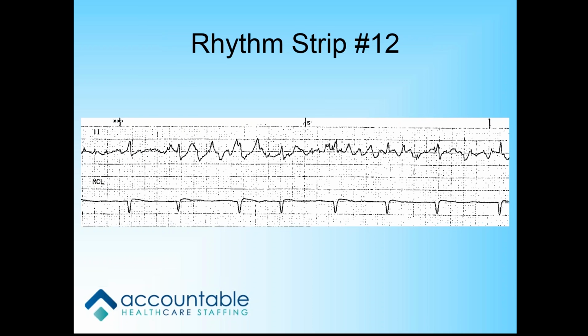Okay. So what rhythm are you in? AFib. Exactly. So your clue here is that it's irregular. Those are fibrillating lines in there. That's why, like I said, you need to go fix lead 2 so you can be sure to see it. Okay? Next.